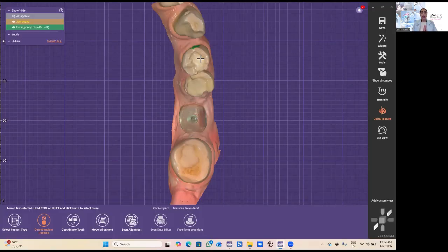Let's start designing a single implant case using the innovation of the iPhysio. Before we begin the designing process, there are 3 important pieces of information we need to know. First, which type of the iPhysio is being used. As we mentioned before, we have 4 different types of the iPhysio: type A, B, C and D. Second, if type B or C is used, we need to identify whether it is the short version or the standard version. Third, we need to identify the gingival height.